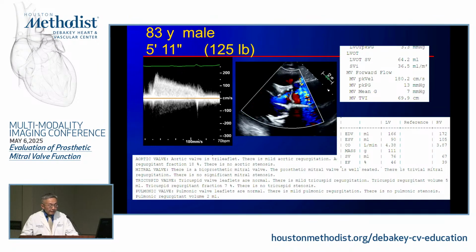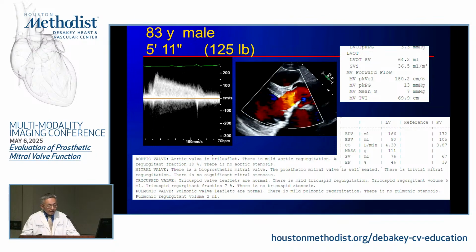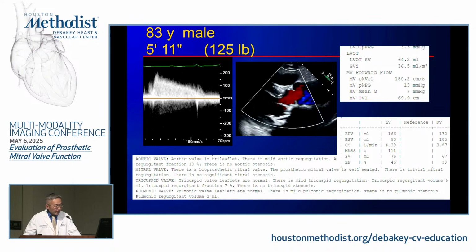So the MRI says there's no significant prosthetic valve stenosis. Valve area 1.5, which I think is abnormal anyway. I don't know, maybe just a typo. But the valve area was 1.5, and the stroke volume through the LV was 76. It was done a couple of weeks apart, and the patient didn't receive any, I checked, didn't receive any significant treatment. So I don't know. I agree with Carlos.